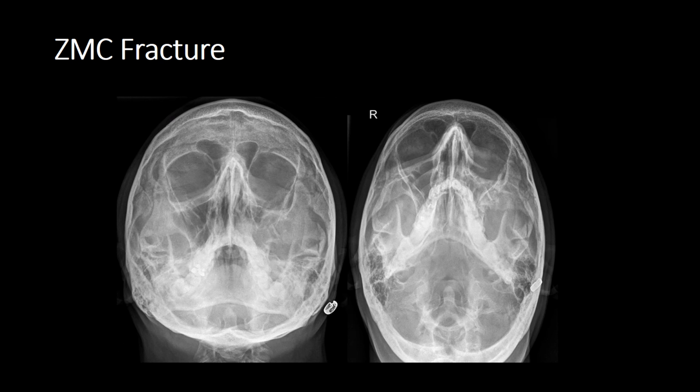Okay, line 1. We start at the frontozygomatic suture, over the superior margin of the orbit, over the glabella, over the opposing superior margin of the orbit, and here quite clearly we can see a disruption to the frontozygomatic suture on the left. Look at the right, there's alignment, there's no diastasis at all of the suture. We can see that the suture has completely separated, so we have an abnormal frontozygomatic suture on the left.